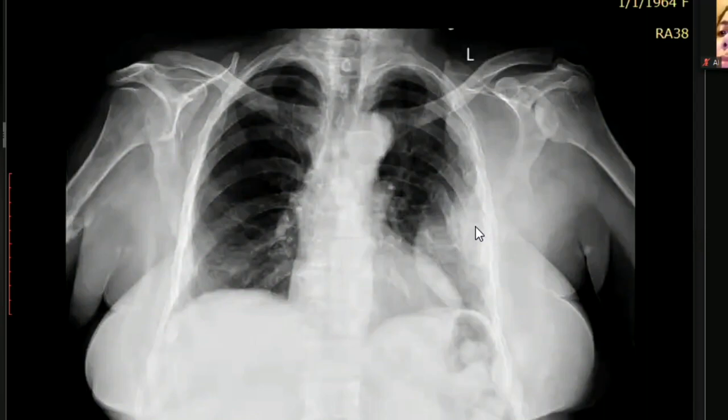And again, with this appearance, with non-visualization of the ribs here, and the cortex is not visible in this area. So at least you can see that I cannot see the cortex and the bony margins of the ribs. I would like to review these for any involvement by an ongoing process or any metastatic lesions. Then when you again look at the bones, you will see a lytic lesion in the scapula. It's very clear if you look at this. On the right side, the cortex is here, the cortex is here.